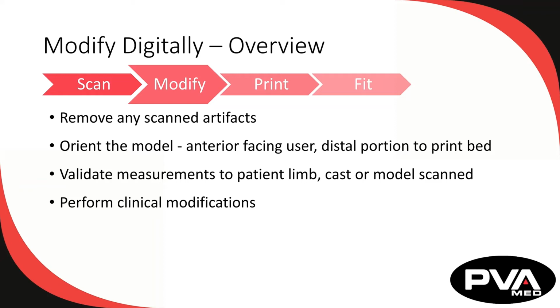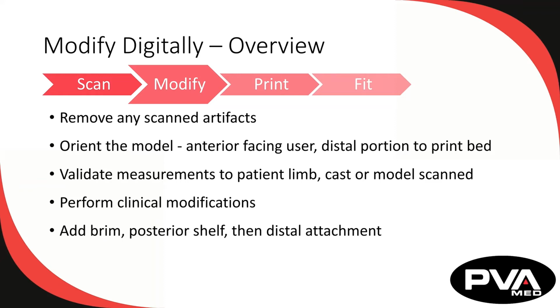After completing the clinical modifications, users can add a brim using the tools available to align, merge, then blend the brim for a smooth transition to the rest of the model. This can greatly accelerate device design. The same applies to distal attachments, where users can add, align, merge, then blend distal attachments also for a smooth transition to the rest of the model.